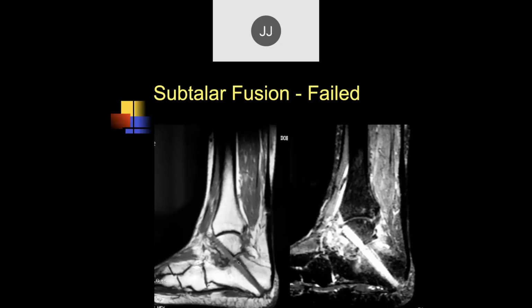Now, these attempts to fuse the subtalar joint with this kind of a screw, going in from the tip of the heel, is not a good idea. There are much better ways to fuse this joint than what we see so far.